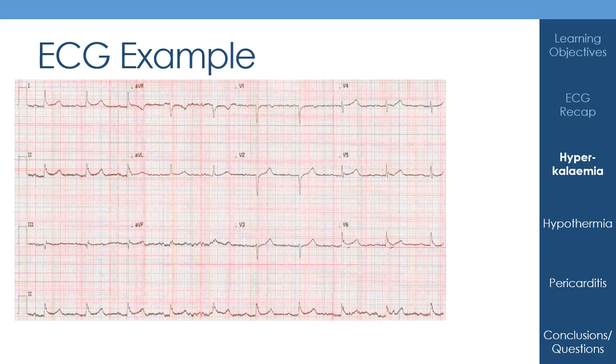Okay, so here's another ECG example. Feel free to pause the lecture and go through it, and then we'll go through it together. Okay, so hopefully you've had a chance to go through this ECG. So starting at the top, I haven't provided you any details, but let's say for the sake of argument, this person was found on the side of the street at 3 in the morning.